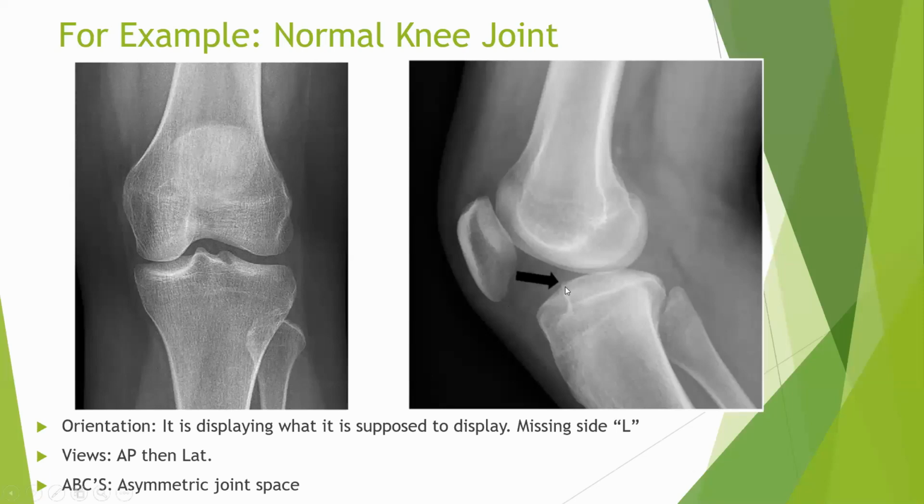Now, going towards the lateral view, look at this patella. It is pretty high, right? Right over here, and it's probably grinding against the femoral condyle. Look at this very faint thick white line; this is probably a sclerotic plaque of the cartilage. When the cartilage is grinding for a long period of time, there would be abnormal or pathological thickening of that cartilage. This is probably the case right over here, where you have a little bit of sclerotic plaque between the patella and the femur.